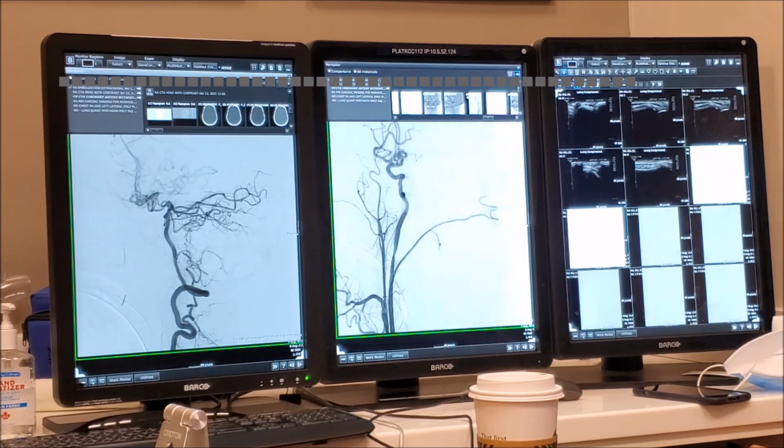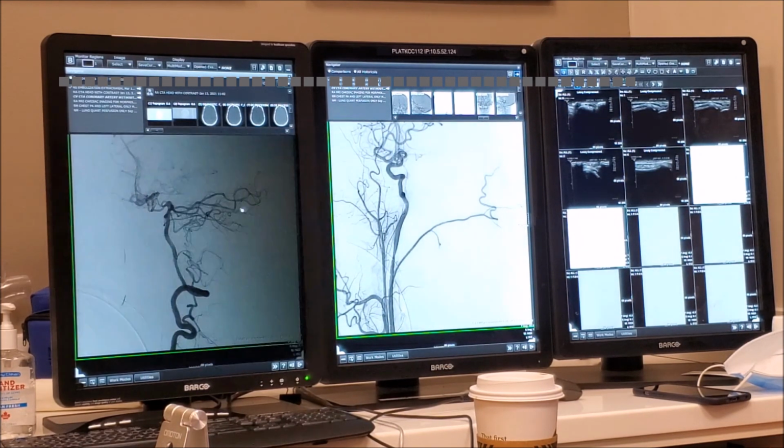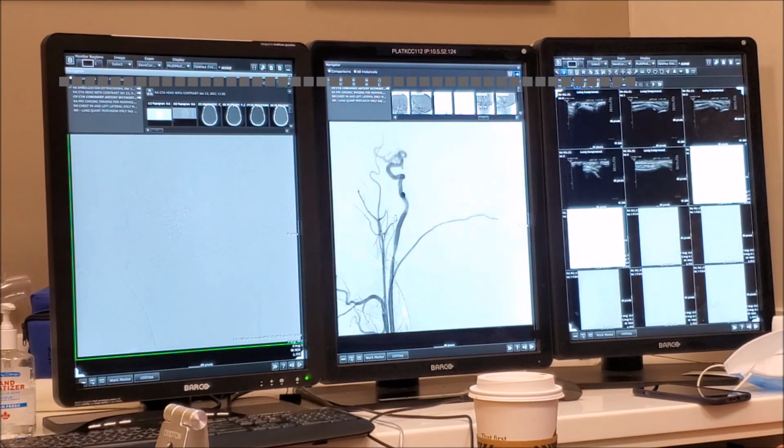Definitely this is a meningeal artery. It's a cutaneous artery too. And what is this one here? Is it the clival? Well, yeah, but I need to connect it somehow. I mean, I can see the wall. You see, I can see the wall of this artery, right? So it's not part of the internal carotid artery. I think it's the same one as this one. I'm not sure.